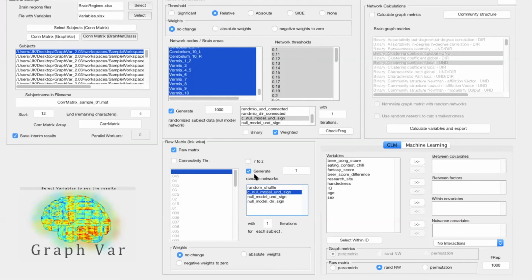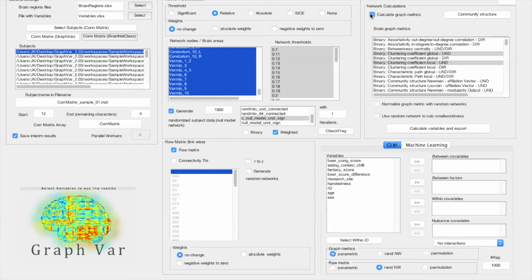This in the end brings me as well to the kind of statistical analytic approaches that you can do by means of the bootstrapping approaches that we provide you. So previously I've spoken, and again here also for this above network construction panel, about the possibility of generating subject-specific null model networks. We have this here, right? So now it's gray because I didn't highlight it. So okay, now it works.